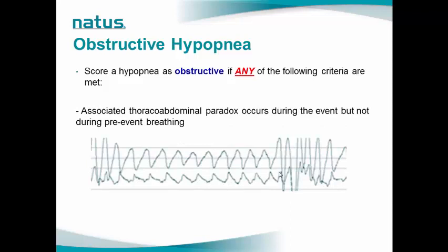and there should be an associated thoracoabdominal paradox that occurs during the event but not during pre-event breathing, as a sign of obstruction.